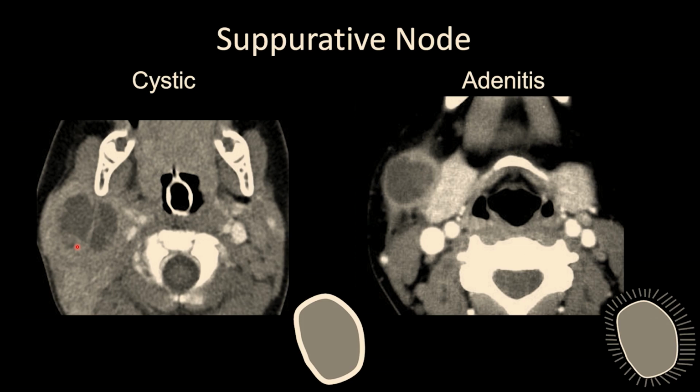But you want to start in the middle and work your way out. I see central low density. Is it complex? Is it nodular? Is it septated? Are my borders good? If my borders aren't good, what's happening to the surrounding soft tissue? You've got to tease out the morphology very carefully with a routine. That routine starts central and works its way out from these lymph nodes.